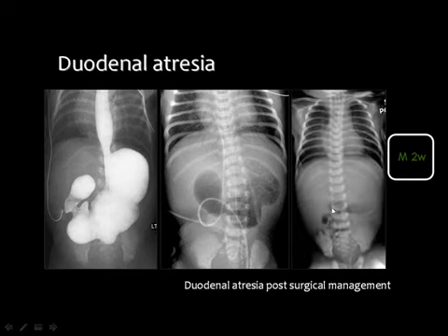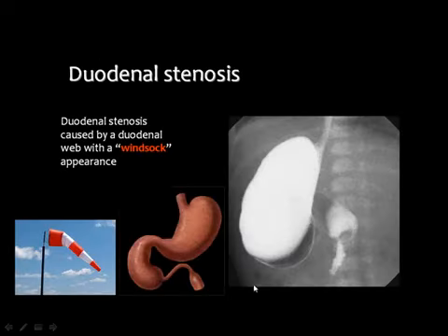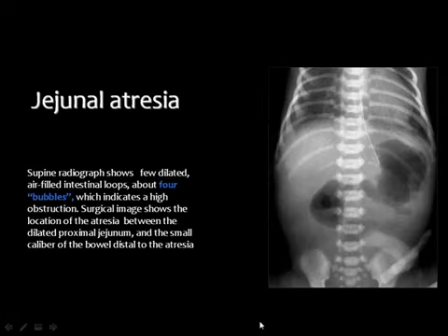After treating this patient, you can see air is in the small bowel as well. And this is another appearance of plain film showing the double bubble configuration, diagnostic of duodenal atresia. The stomach is distended by air, and the proximal duodenum is also distended by air. In cases of duodenal stenosis, some barium will pass the stenotic segment to opacify the distal loop of the duodenum, and you can see dilatation of the proximal part as well as distension of the stomach, exactly similar to this configuration.